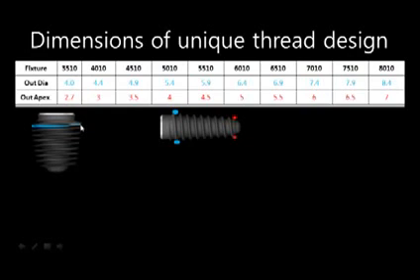Let's take into account the form or shape of an extraction socket. As you all know, it's sort of like an ice cream cone. It's wider at the neck, so it's sort of a V, and it's wide at the neck here. Well, that extra little bit of width at the very top gives you the ability to get really good stability in extraction sockets. So the 3.5 again is the only one that's 0.5mm bigger. The 4.0 through 8.0, all of them are 0.4mm bigger.